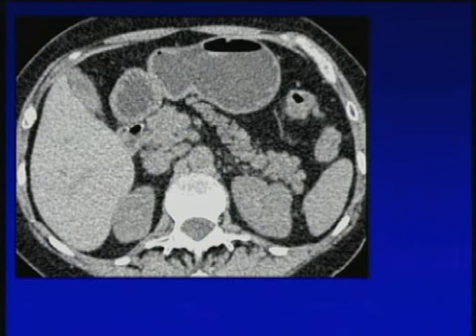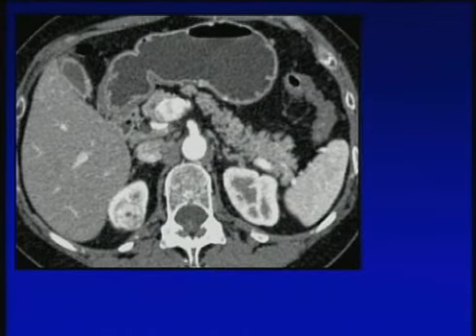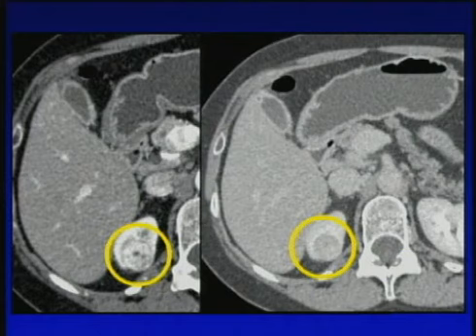As we look at the best phase for this renal mass, you can see on the cortical medullary phase, you do visualize the patient's lesion right there. And I would agree it's relatively subtle, but still is pretty easy to visualize. But I would say that on the excretory phase, it's a little bit easier to see. So one of the things to recognize is that lesions are typically seen on both phases of acquisition, or all three phases if you do a 90-second acquisition. One phase may be better than the other.